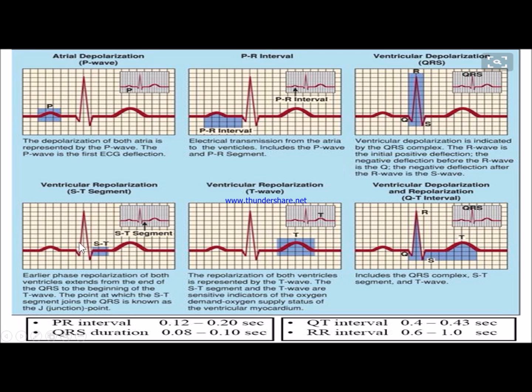This is P, Q, R, S and T. This is the QRS complex and this is the T wave. In between is called the junctional point. This junctional point is always helpful to diagnose in exercise ECG testing, so we need to always remember where the junctional point is. ST changes are sometimes helpful for diagnosis of myocardial infarction patients, so it is very helpful for diagnostic purposes.